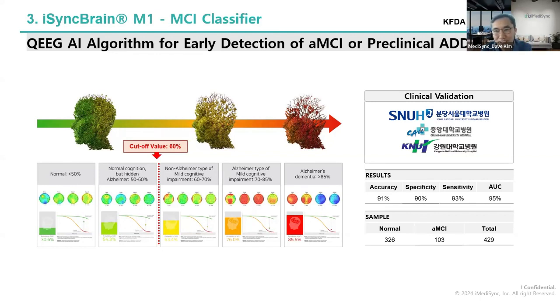But sometimes the clean data is not perfect, then we need to add manual denoising for making more reliable data. So two different factors affect the accuracy of the MCI biomarker. One is the wet-dry recording difference. The second one is the automatic denoising quality. That makes a little bit of change in MCI results. So we need to review the clean data first before using the biomarker results.